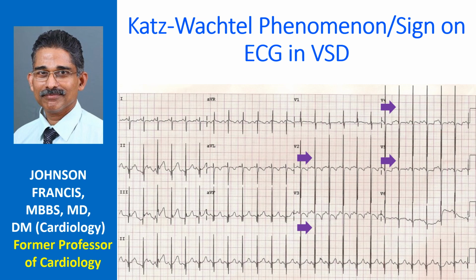The sign has been described in VSD with biventricular hypertrophy in children. It can be seen with isolated VSD as well as complex VSD. In fact, the article cited from Circulation was on complete transposition of the great vessels. An ECG with Katz-Wachtel phenomenon is shown here.